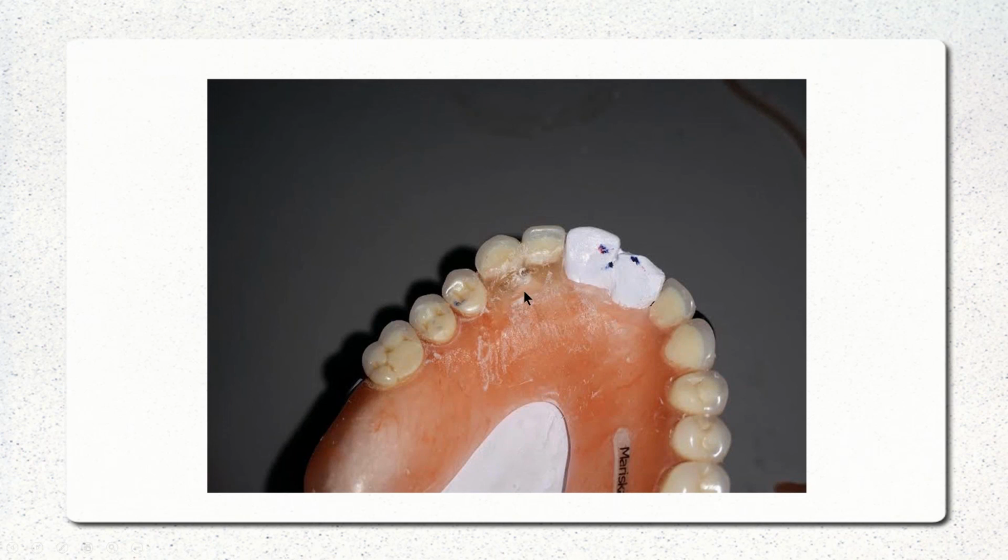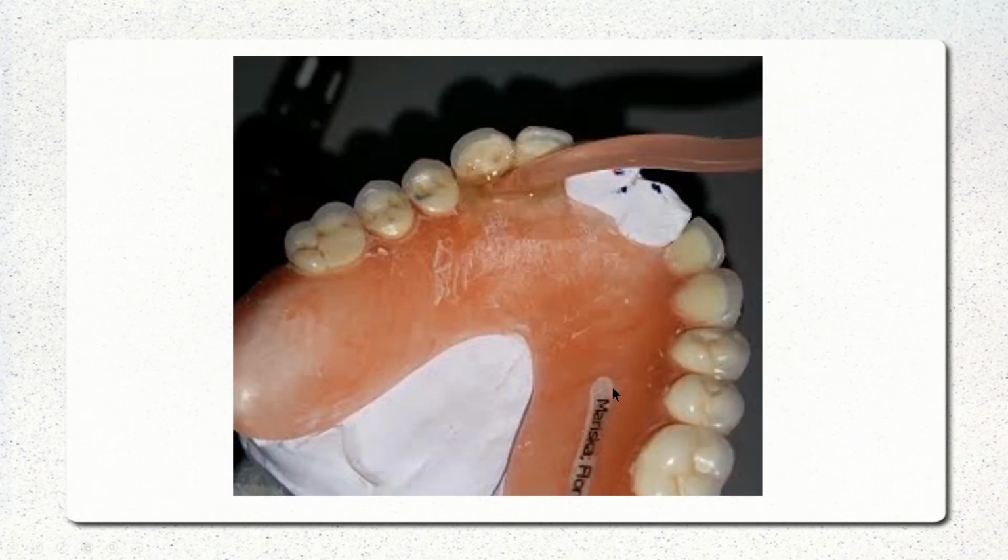You can actually take a little sprue. The gun always has a little excess. As you go through that process, you can make little welding rods with it and actually just heat the area, heat the rod, just squish it in there, let it cool, snip it off and smooth it up.